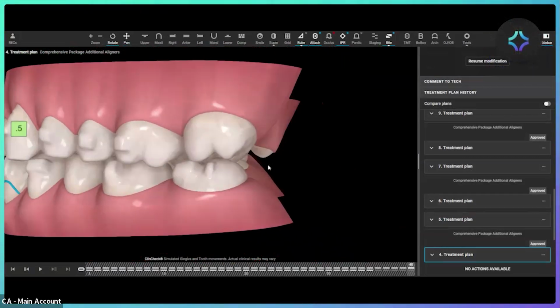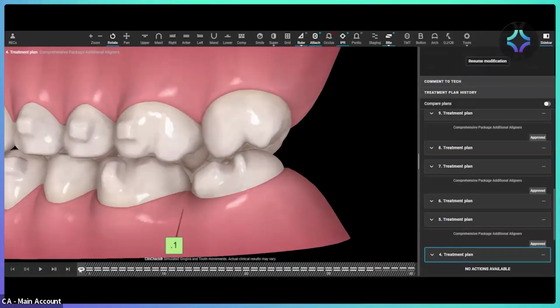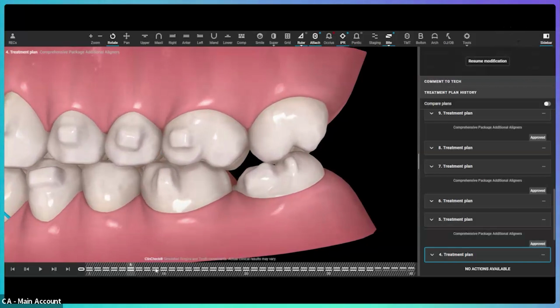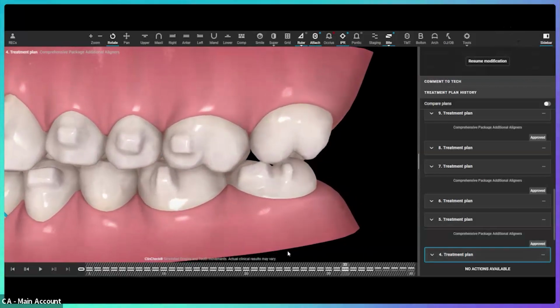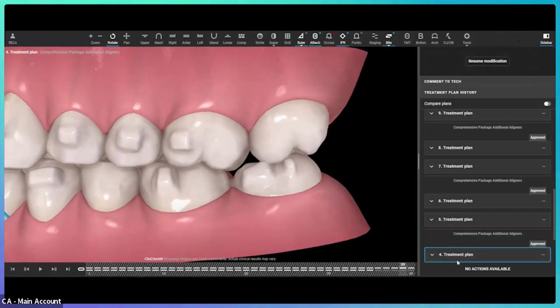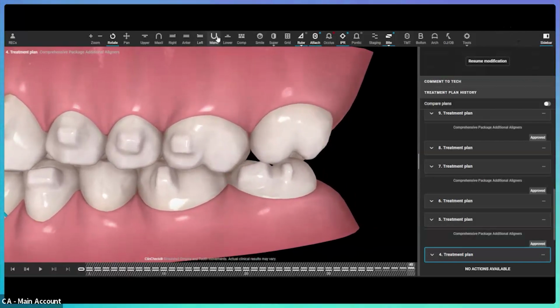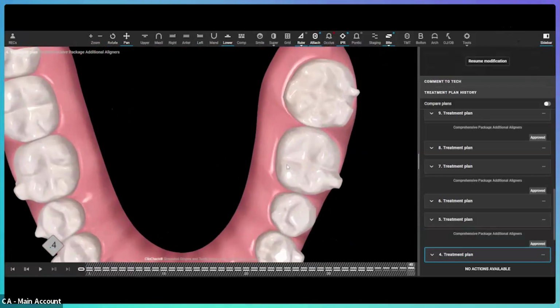So let's go ahead and take a look at my molar region. We've been going through a lot of basic stuff so far, but now let's get into the complicated. You're not here for the basic, you're here for the crazy. So what are we trying to do? We're trying to do nonsense is what we're trying to do, right? This is never going to happen.